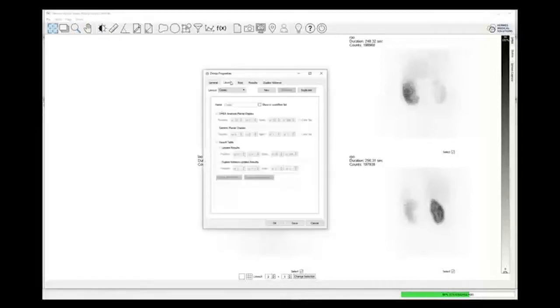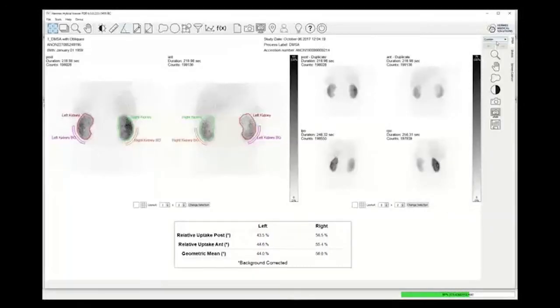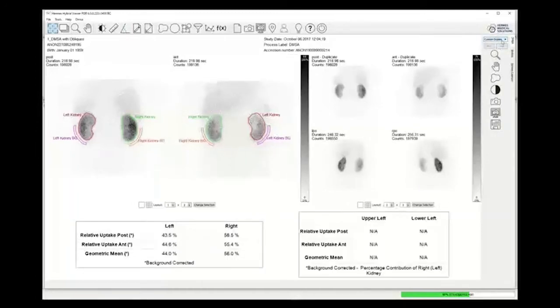Similarly, just going back to layout options, because we have many more layout configurability options here, you can create custom layouts both for your non-duplex and for your duplex kidneys. Because you're creating them in the layout page here, on the application window, you can flick between the two different layouts.